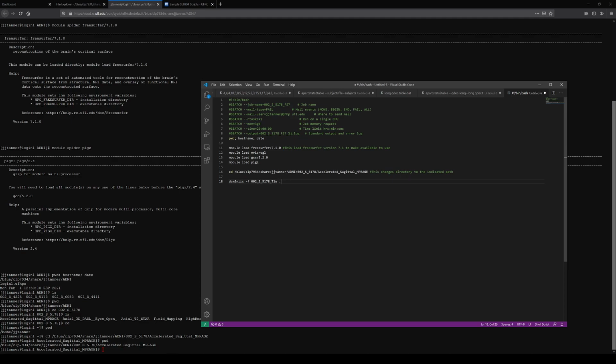So now what that does is it'll convert this directory, really it looks in subdirectories, and it'll save out a file called that within our current location. If you don't want to change directories first, you could put in that whole path, and in both places for the file output, or if you want to save it elsewhere, you could put in a whole path instead of a dot. But we're just changing directories to be a little easier.